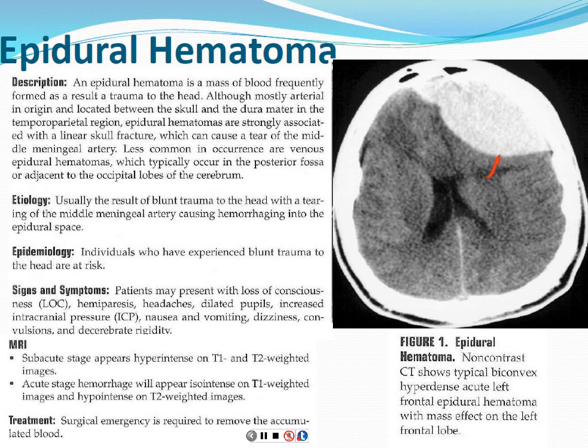This is a big emergency. That other bleed I showed you wasn't taking up a lot of space, but you can see already that this is a very large area of density. This is CT once again. This is an epidural hematoma.